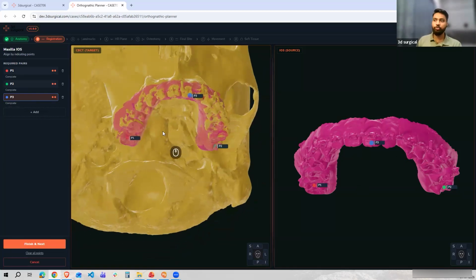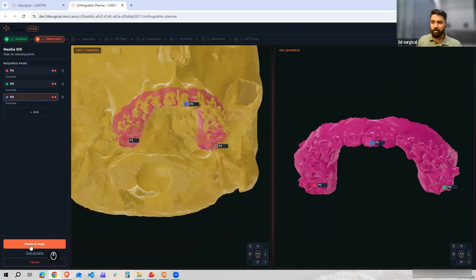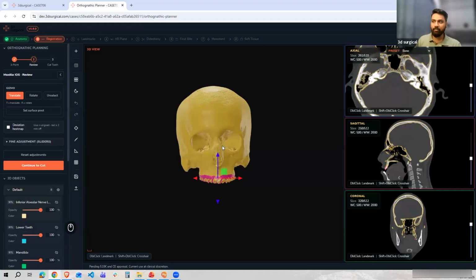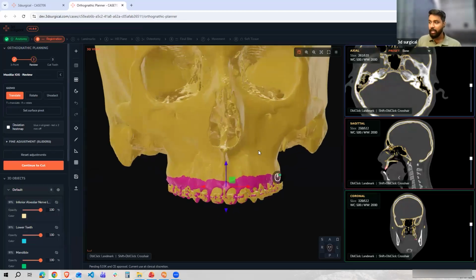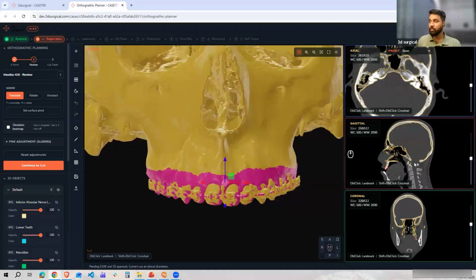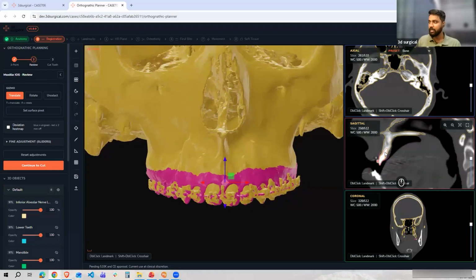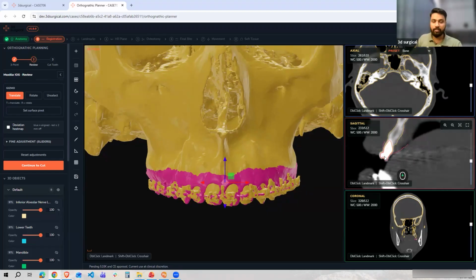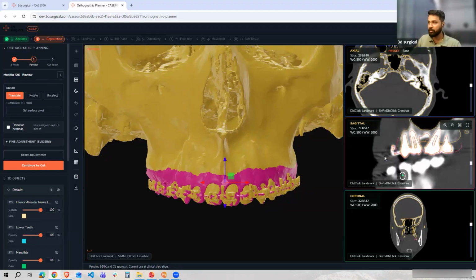So still, if we want to do the modification, we can do. But generally, more than 95% accuracy will be done. And then the next step is about the review only. So if you want to review this data within a scan, because if we look into the scan contour, it will give us more idea and more confidence whether it is registered properly or not.